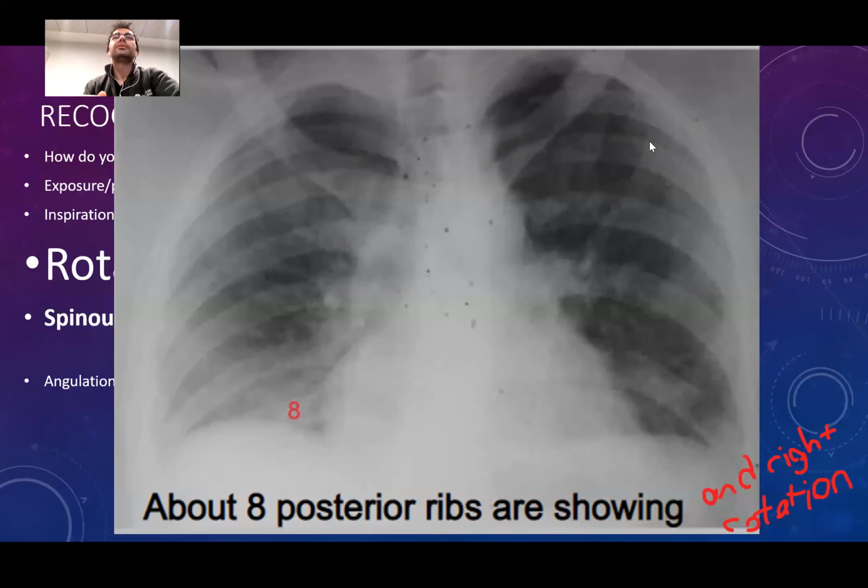Is it the same if the patient has scoliosis or something? We don't have a new rule for scoliosis patients. It's just these 4 rules that you always have to follow. Of course, you have to use your mind to evaluate the situation, since you can see the outlines of all the organs. The rules are 4 rules, and the criteria are very strict and very basic.